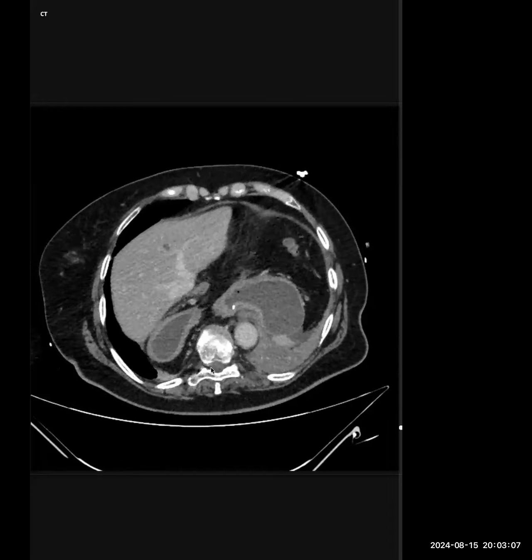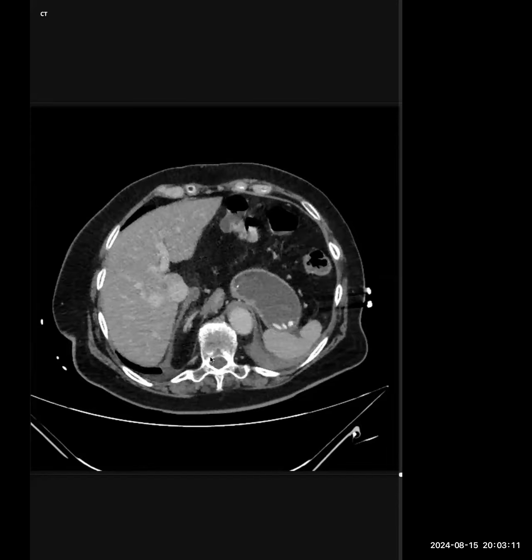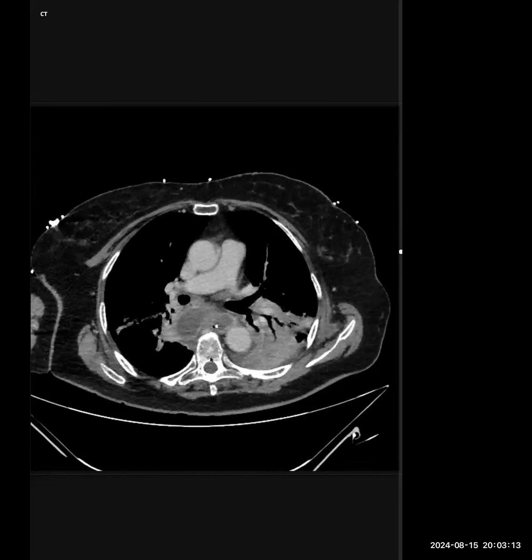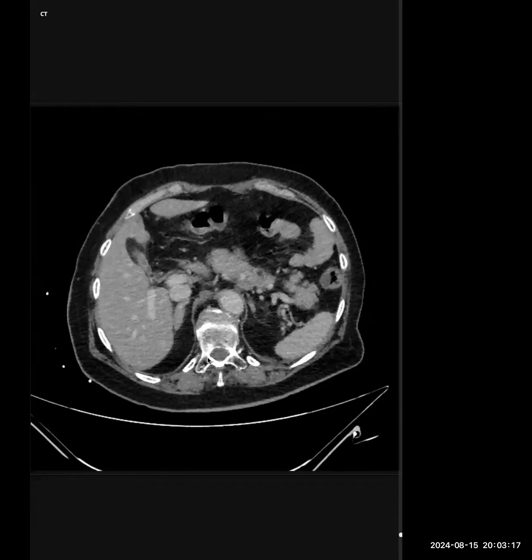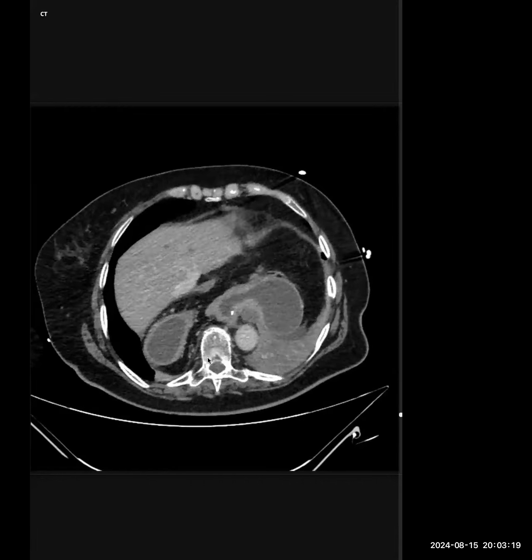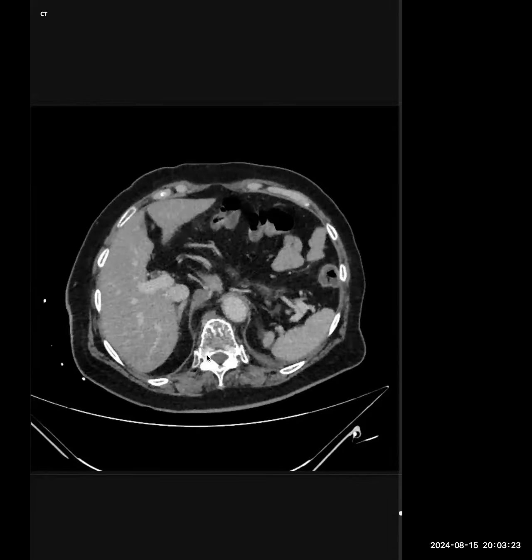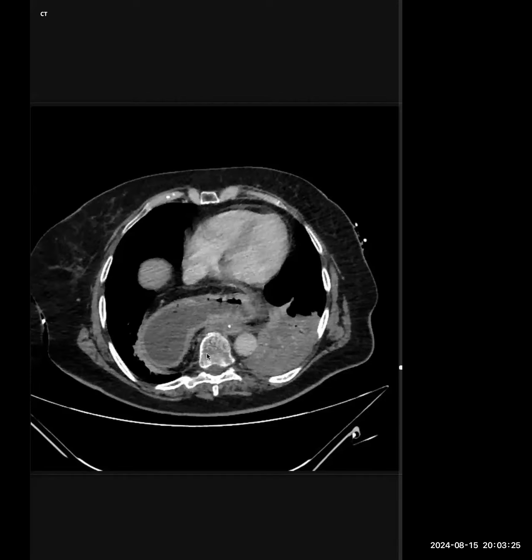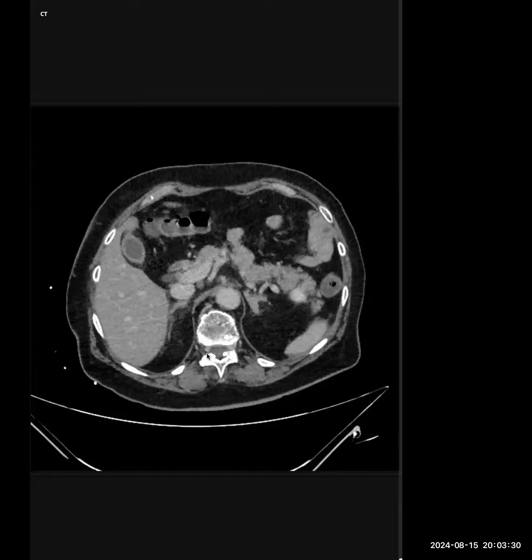Yeah, you struggled a bit with this because you were thinking that this is an esophageal pathology, but then you got there in the end. I agree, a sagittal or a coronal would have helped, but in this exam, they expect you to be good at the axial and then ask for it, because we all know we don't report bowel or GI cases without looking at the coronal. It doesn't make sense. We all do it. Yeah.